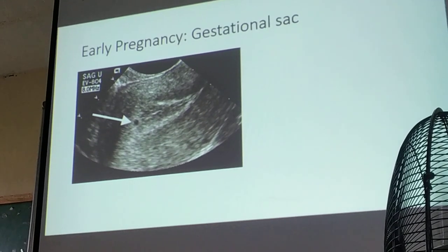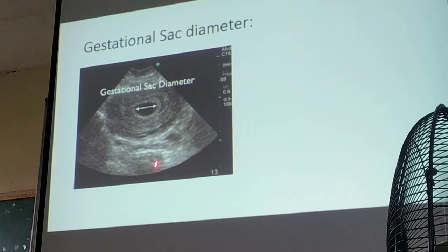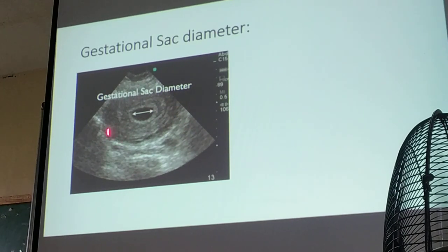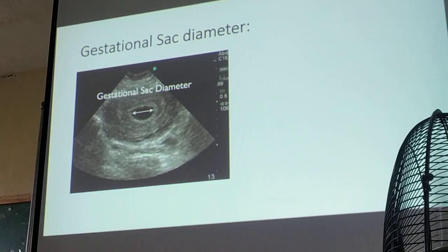Okay, remember this slide. This one. This is more of a transverse diameter of your uterus. Okay? You try to imagine the uterus is almost oval. Okay? It's not pear shaped. Normally, the appearance of the uterus in ultrasound is pear shaped. If you see this as an oval structure, then that's a transverse diameter. Okay?